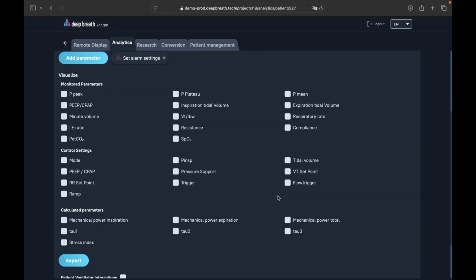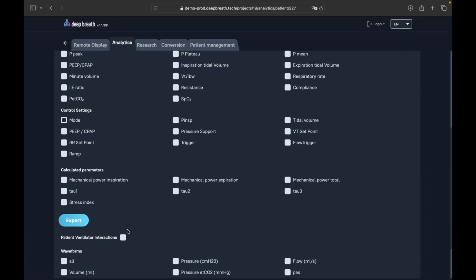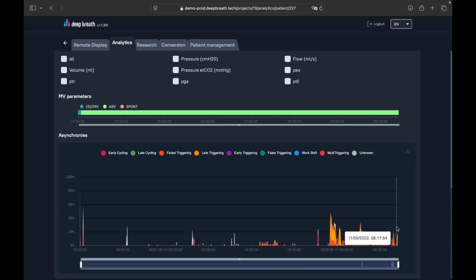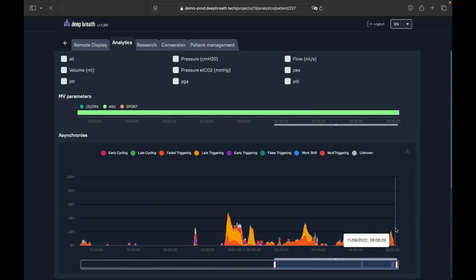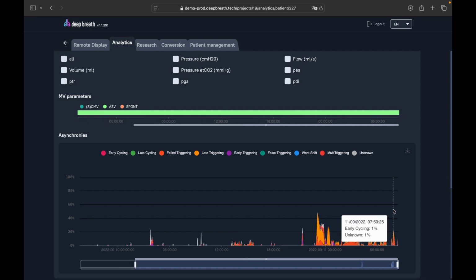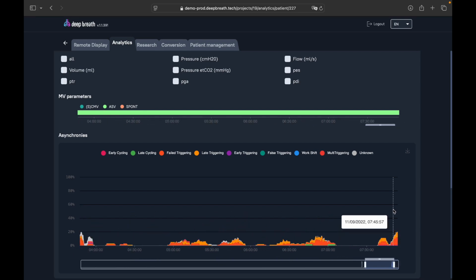The most challenging thing during training of the DBRES algorithm, and I'm really proud that we achieved these results. So this patient is from a control data set, and not a single breath from the whole 45 hours of ventilation was in the training data set, so it's an absolutely clean experiment.